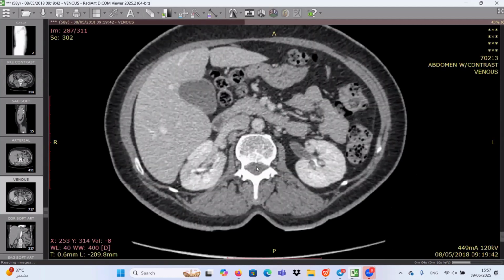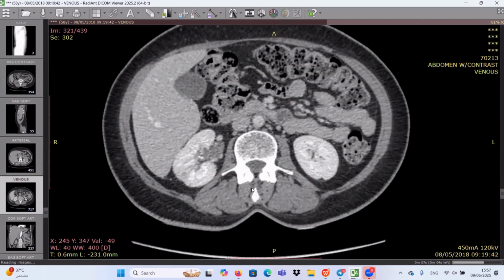Is obstruction this one will make something like this? Yes, it's mostly due to chronic post-obstructive uropathy that would lead to parenchymal scarring.